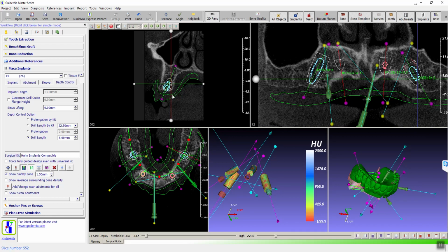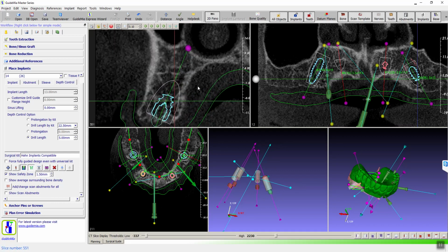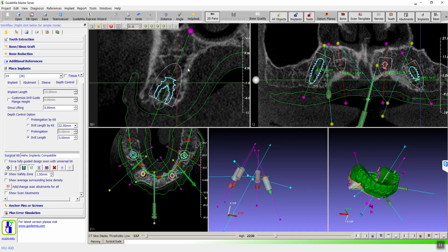That's pretty much for the placement. Now I go back to stop this function. And then for case communication, documentation, we want to do the bookmarks things.